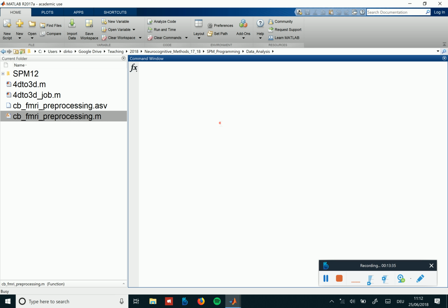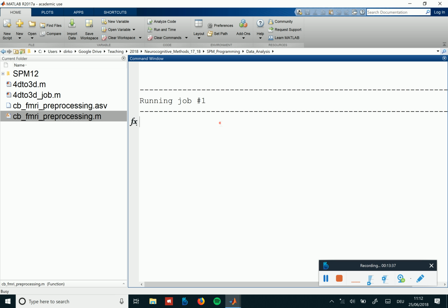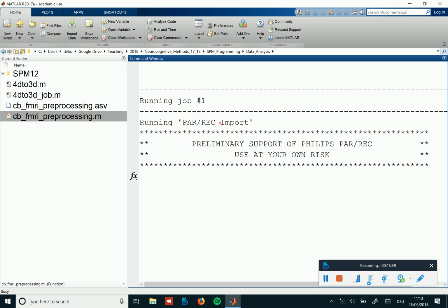Why did you put an empty string inside the output directory? Yeah, so when we specified that in the batch editor, the only thing that we had to specify is which file we want to convert, and then we had the option to specify the output directory, but we didn't have to specify it. But what is the default then in this utility is that there's an empty string specified for the output directory if you don't specify the output directory.